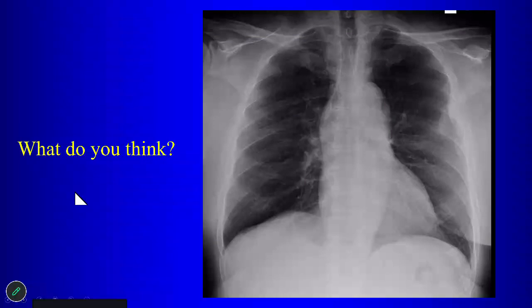Who wants to discuss this? Opacity on the left, subpleural region. Okay, that's more of a sessile shape compared to the prior study. So what's your differential? Maybe a solitary fibrous tumor or loculated effusion, or metastasis, primary lung cancer.